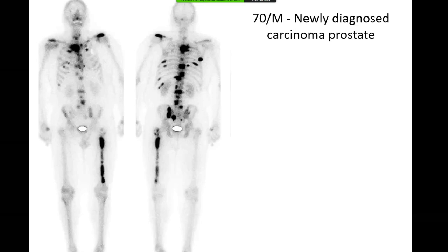Yes, you're right. These are metastases. Just a few observations on the basis of these images. While you can almost certainly say that these are metastases, what you cannot say for certain is that these are osteoblastic metastases, because osteoblastic is a terminology that you would only use when you have the X-rays in front of you, and if you see sclerotic changes at some of these sites.